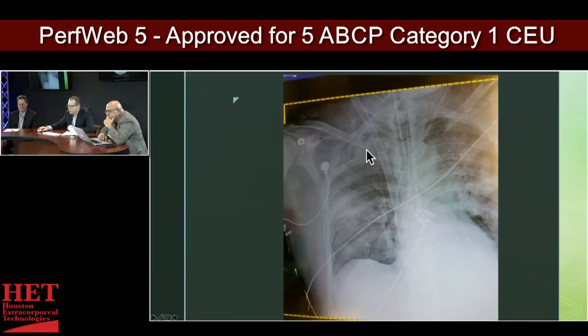But you can see that this is the Avalon cannula coming in down here. It's in the right IJ, you know that because you put it in. And then you advance it over a wire with either fluoro or TEE, so you have it in the right position, so you know it's coming down. So you know that this is the superior vena cava here, coming down. And where the vena cava meets the heart border is usually the right atrium SVC interface, okay?